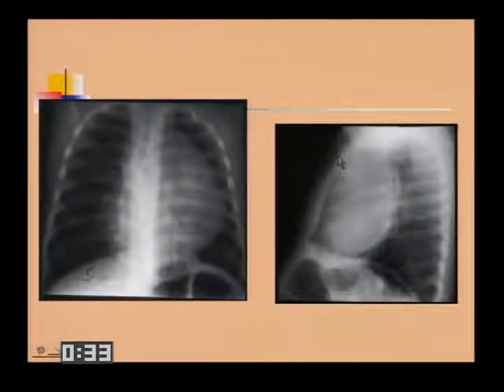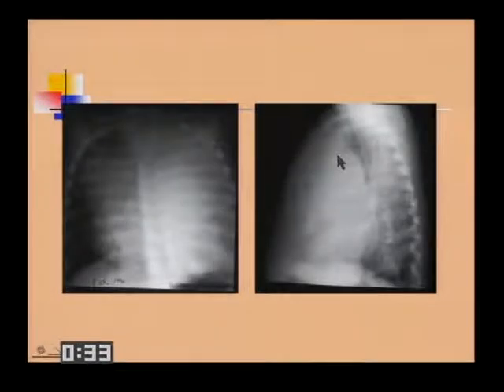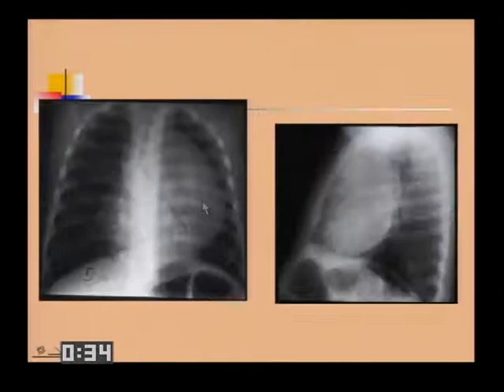When the child came back 7 months later, there was a huge mass. The trachea at this point was deviated posteriorly. It was deviated to the left. There are a few calcifications within it, and this is now an example of a teratoma. Was there a teratoma there before? Should every child with a thymus this size be followed up? The general feeling is that this child is entitled to a thymus this size, but he certainly probably falls at the far end of the normal thymus spectrum.